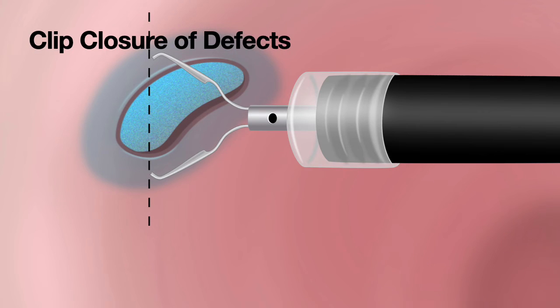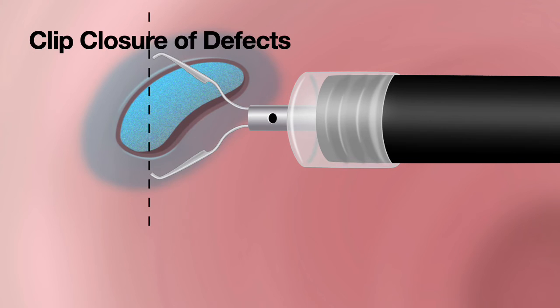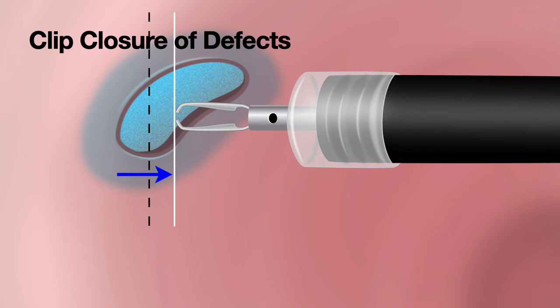So here is a clip, wide open, and say for example, you close the clip. What happens? The clip retracts by a few millimeters. Open clip, and when you close, it retracts by a few millimeters.